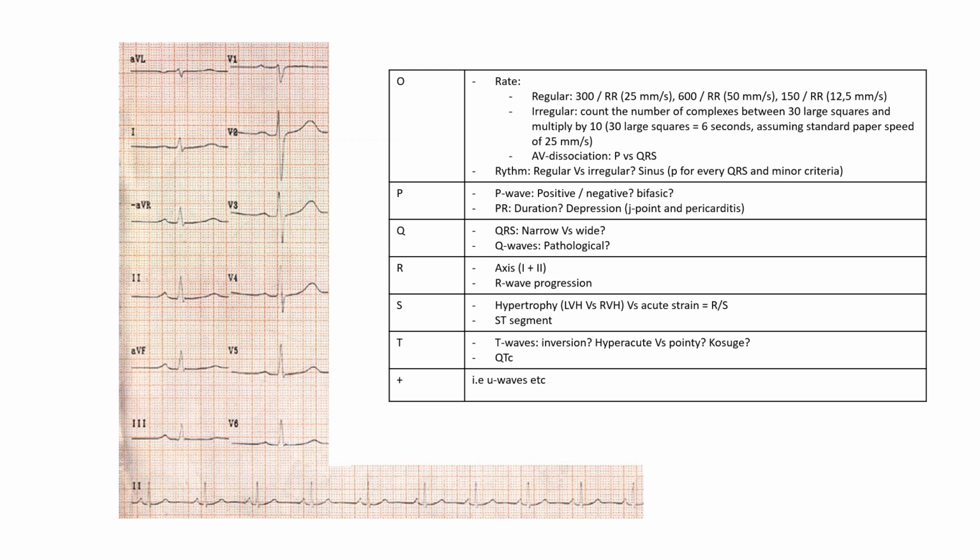Hypertrophy, well, you measure the left hypertrophy in the precordials, at least. So how many is there? 7 boxes from the deepest S wave. So let's see, 1, 2, 3 big boxes here, and 1, 2, maybe 2.5 here. So that's 3, 2.5, that's 5.5 big boxes, right? And that's 27.5 millimeters, and this should be 35 millimeters. So it's not hypertrophic, and you can use these over here, but I usually don't.